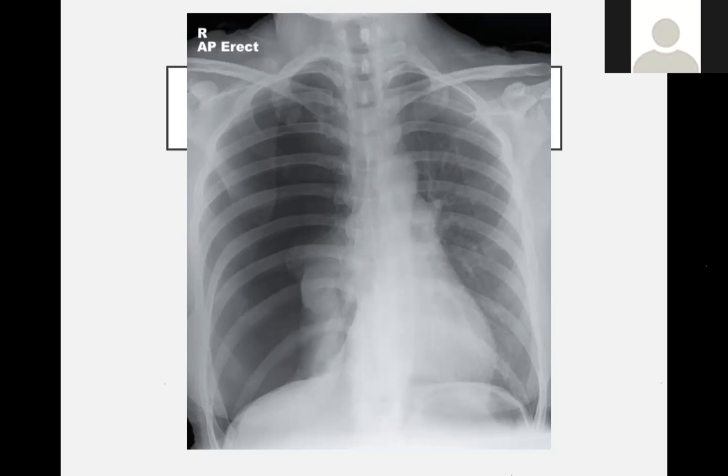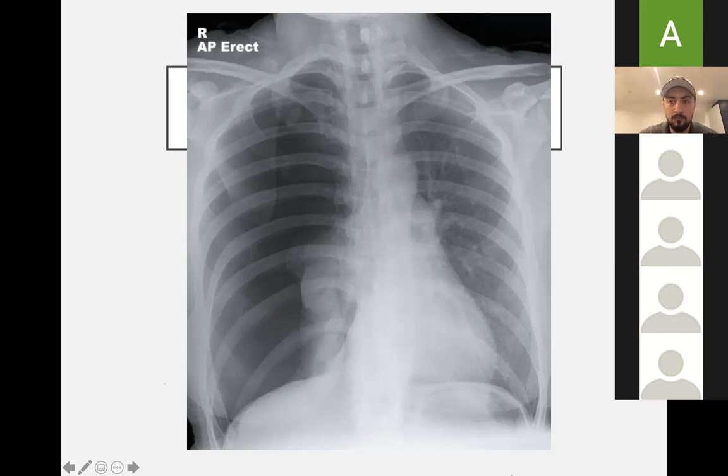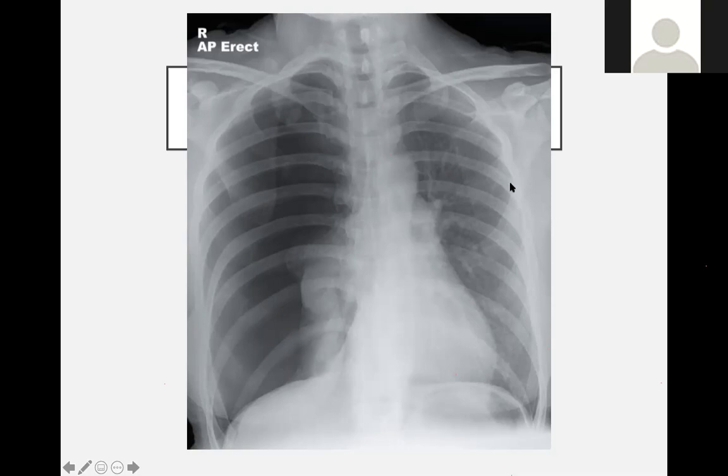An exposure, again, you can see the spinous processes, so it's fine. Then moving on to the ABCDE approach, the airway, if you look at it from the top, it's deviated towards the left. So that's an important sign. And then looking at the lung markings on the left, the lung markings are nice and clear.